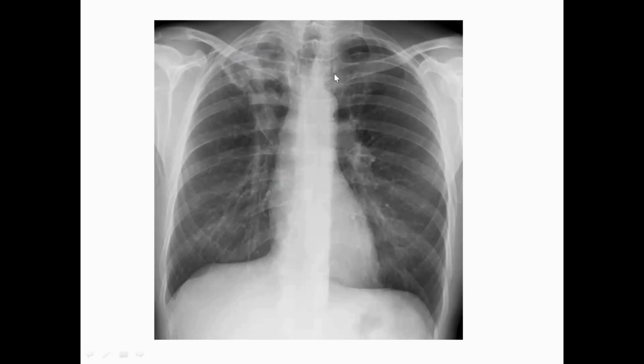How are you going to interpret this? We say compare, yeah? If you compare left apical to the right apical, do you see any changes? If you just glance at this CXR, you'll say, oh, it's normal. But if you go systematically, as we say, compare right to left, zone by zone, you're not going to miss it.